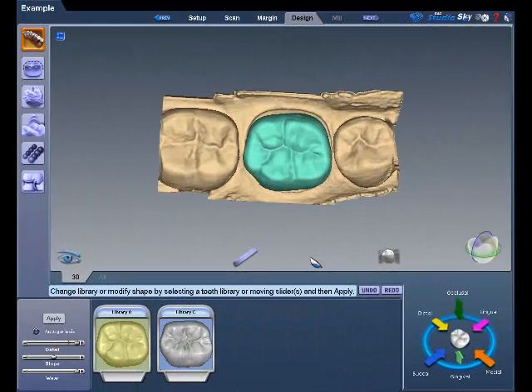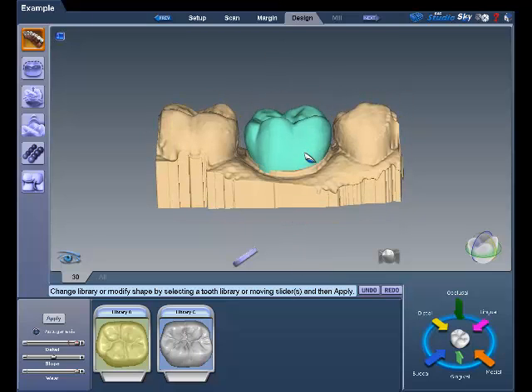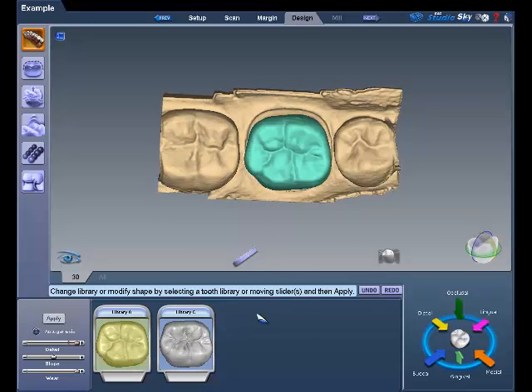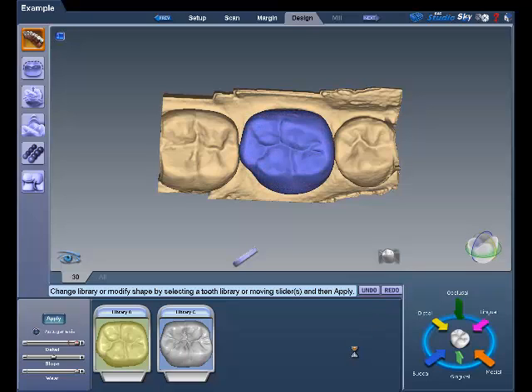Starting the design workflow on the Tooth Libraries tab gives you the option of changing the preview tooth properties before generating a proposal. Resize and/or move the preview tooth. Change the library selection. Deselect autogenesis. Or you also have the option of changing nothing and simply clicking Apply. Click Incremental Change Tools or Freeform Change Tools to proceed with your design workflow.